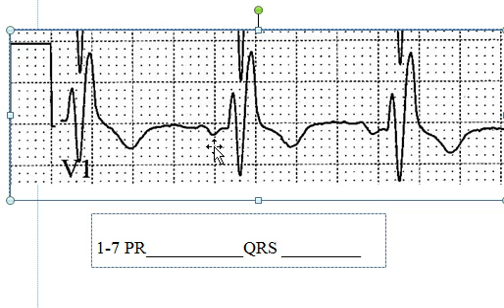This is called a biphasic P wave, meaning it has two parts, like a bicycle, two parts. This is common in this particular camera angle with the lead setup that we put on this person. This lead is set a little bit to the right of the heart on the person's body, and so sometimes we get funky P waves, something that we'll talk about at another time.